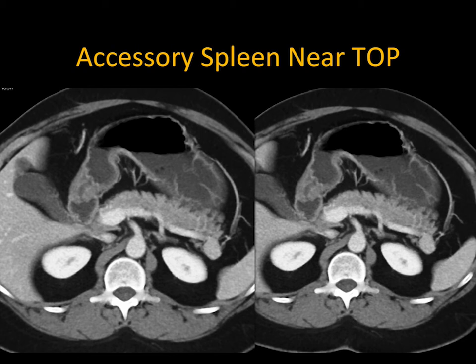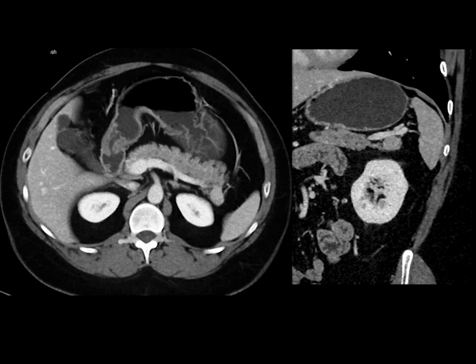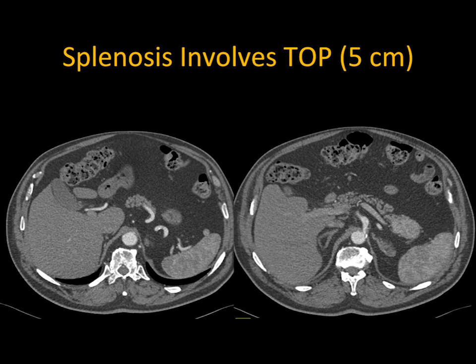And it looks just like the spleen, an accessory spleen. Here it is again as we go from arterial to venous phase imaging. You can see how the lesion changes with the spleen. And here it is again on coronal views. Now, when you talk about intrapancreatic accessory spleens, they're usually anterior. When things are posterior, it's usually going to be accessory spleens.